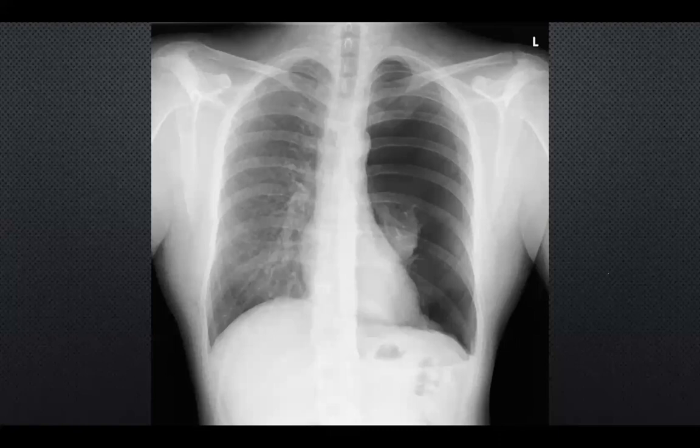Realistically, you should never be X-raying a tension pneumothorax, but once in a while it comes in. And I would say that this one is probably pushing towards a tension pneumothorax, so it would need to be treated immediately. You can also get hydropneumothoraces. So if there's blunting of the costophrenic angle as well, then that could be blood mixed with air within that side. And then you'd always also look to see if there are any lines, any trauma. Why has this patient had a pneumothorax? Is it a spontaneous pneumothorax, or has there been trauma? And if so, then you want to look for any rib fractures around that area, any reasons for the trauma.